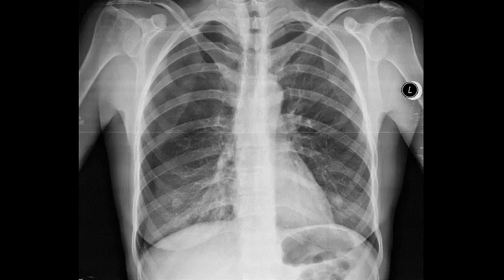The first important thing to see is the lung field. So this is the lung field, and here we have the left lung. The left lung is normally expanded. We don't see anything specific here. Here is the hilum. Here are the borders of the big vessels and the heart.